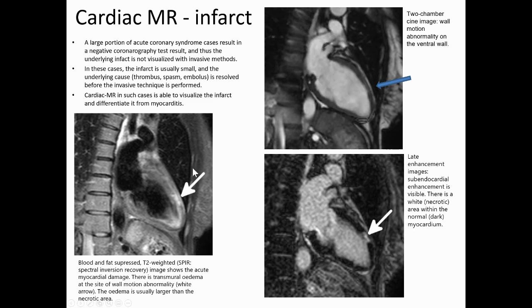So next we will look at the T2 weighted image, and you remember from the first talk that I told you that on the T2, things that contain a lot of water, so areas of edema, will light up quite bright. So the area that looks a little bit lazy on the cine image has a lot of edema in it, which is not good.